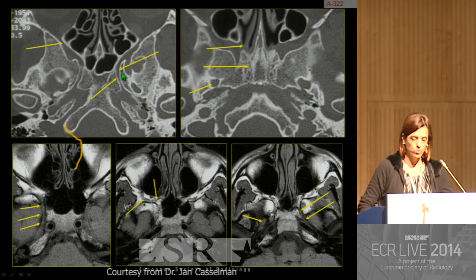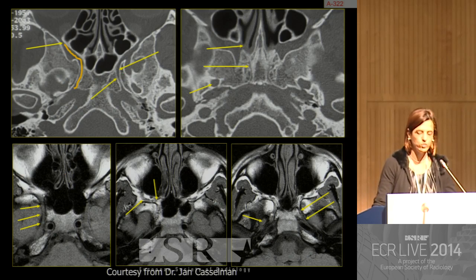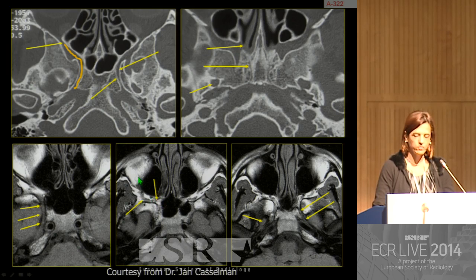And this gives way to the maxillary division of the trigeminal nerve, 5-2, and it has an endocranial opening in the most inferior aspect of the cavernous sinus and goes all the way anteriorly to open in the pterygopalatine fossa. Then you have its terminal branch, the infraorbital nerve, which crosses along the back wall of the maxillary sinus to enter the inferior orbital fissure.